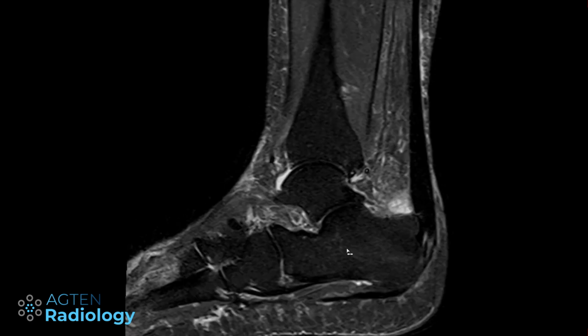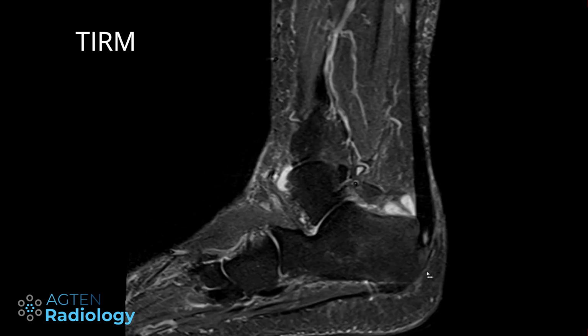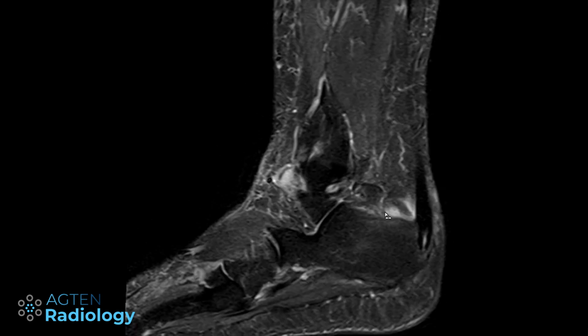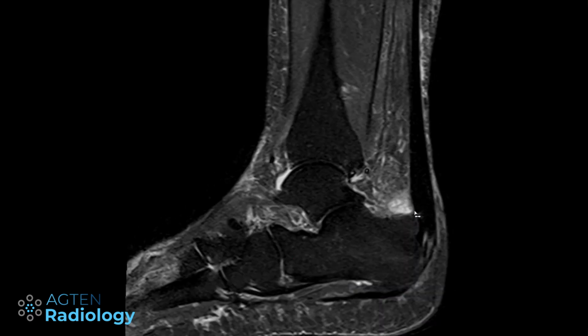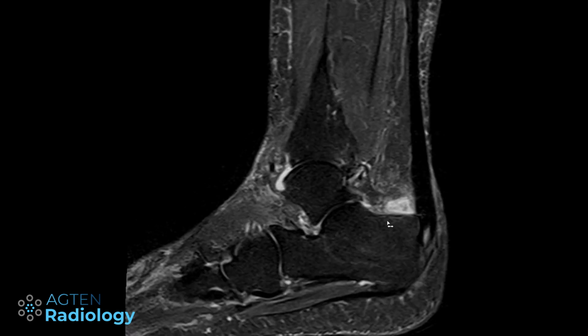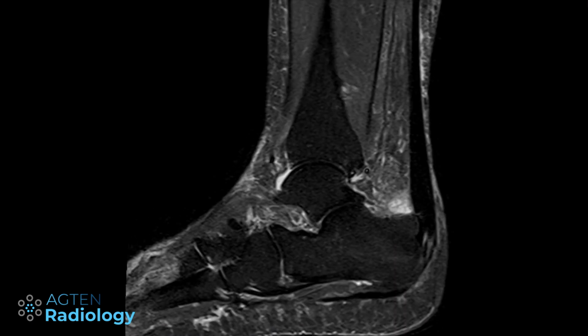And here another case, this time with some tendinosis. We might have an interstitial tear here and some enthesiophytes. And again, we have here this bursitis, and you can again see if we go to the lateral side, it has this funny shape with these two arms, and going medially, then we have this fluid-filled sac here. And the amount of fluid just based from eyeballing is clearly abnormal and therefore a bursitis.